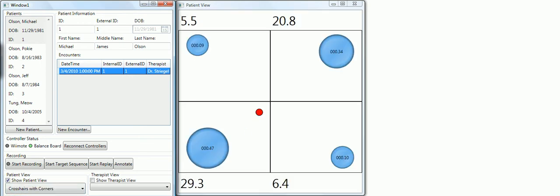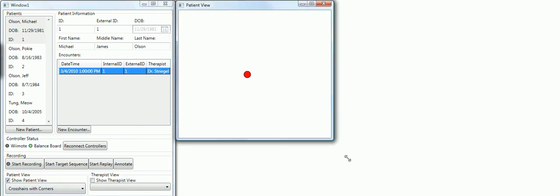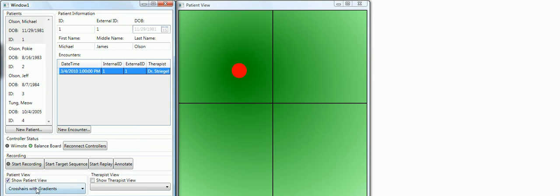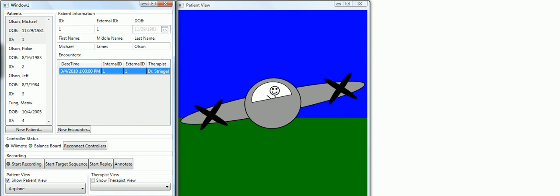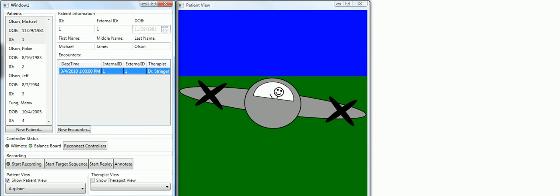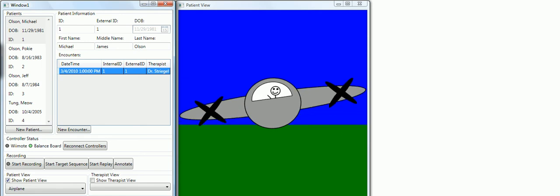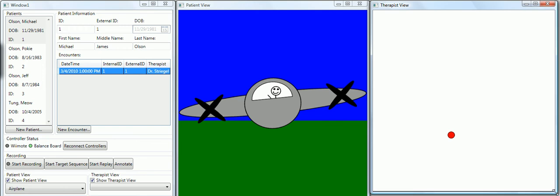So there are various controls here that show all different kinds of information. One example here is this airplane, which, for example, hides the center of gravity dot and represents, instead of as simple coordinates, the horizontal skew as the tilt of the airplane and the vertical skew as the height of the horizon.